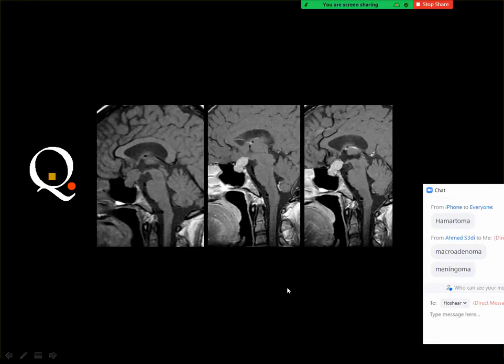there are actually three lesions that involve the pituitary gland and the stalk. These three lesions are Langerhans cell histiocytosis, lymphocytic hypophysitis, and sarcoid. All the three lesions show the same criteria with mild swelling of the pituitary gland and enhancement of the infundibular stalk.